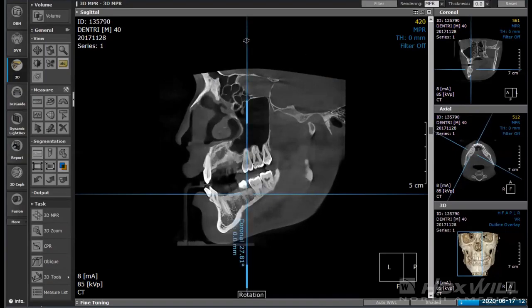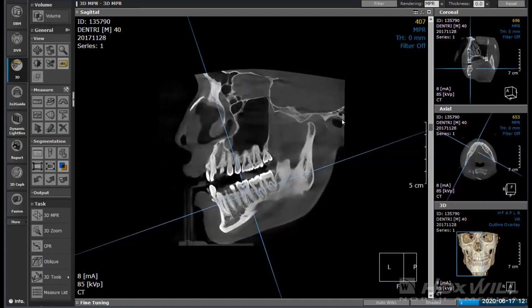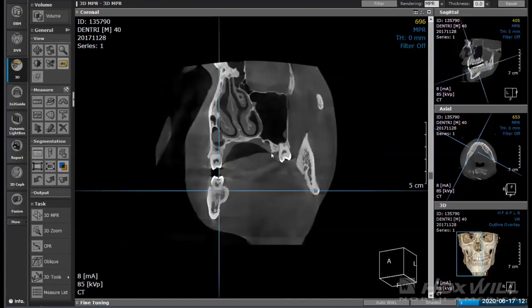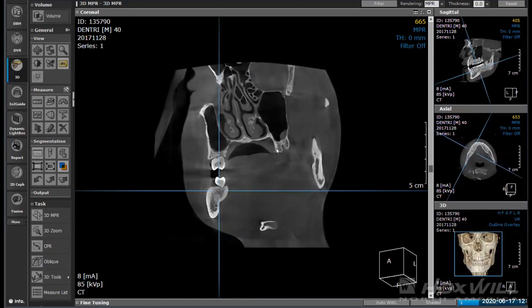And again, just like I said before, we turn this so that we can create a buccal lingual view in the one that we're looking at, and then we can create a mesial distal view. So it's focused on tooth number 29, and we're going to move it all the way to 30. So now we can get a mesial distal view of that area.